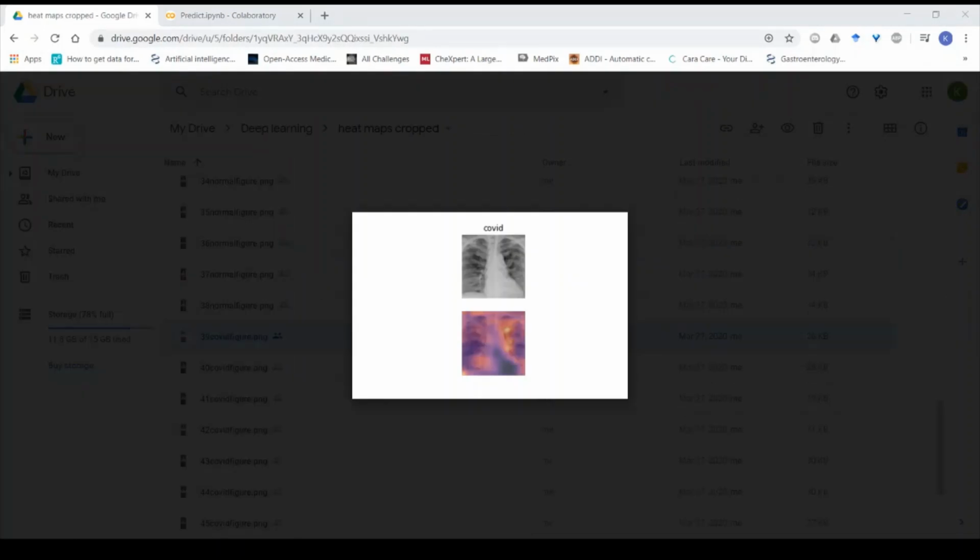Another thing I'd like to point out from my project is the heat maps. The red regions on the X-ray images show areas with many activations, which means that those areas could be possible biomarkers for disease. For example, in this heat map, you can note that it is generally marked red on the edges of the lungs, which could mean that the model is learning to find the silhouette sign that indicates pneumonia, which also clinically makes sense in the case of COVID-19.